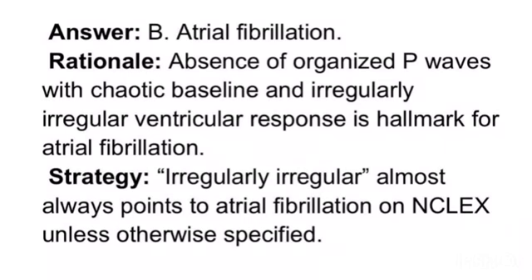for atrial fibrillation. Strategy: irregularly irregular almost always points to atrial fibrillation on NCLEX unless otherwise specified.